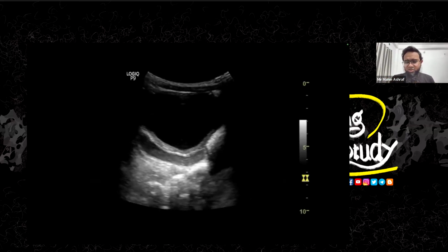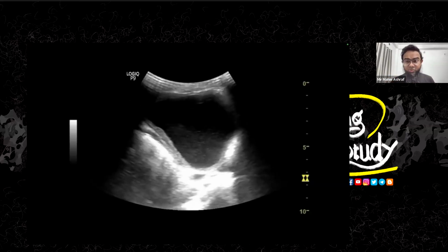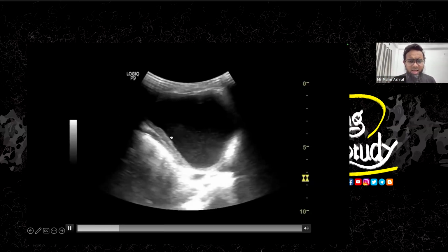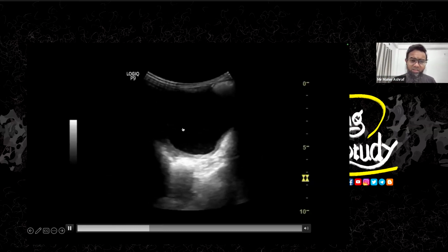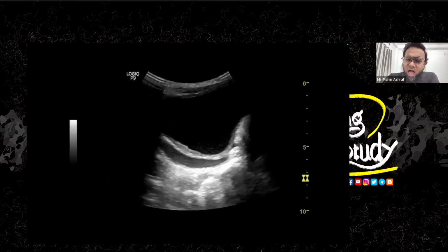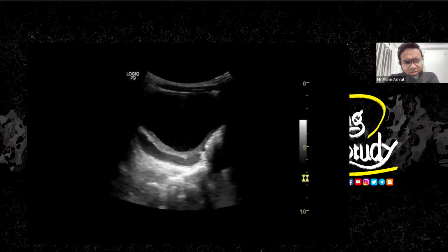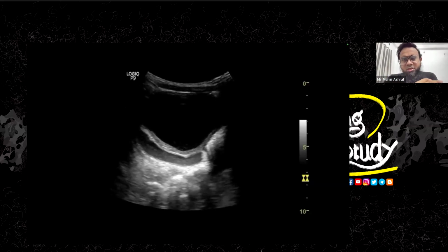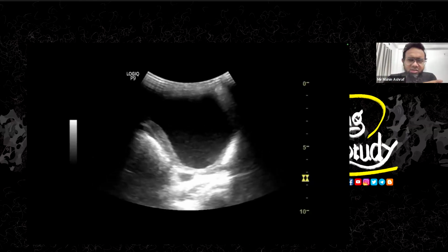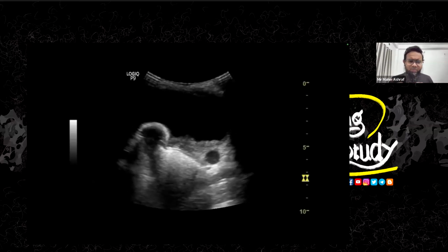I don't have any picture of the kidneys, but the patient obviously had bilateral hydronephrosis. You can see the wall thickening here, and there is a big calculus within this urinary bladder. The patient was around 8 years old, so I was a little bit confused how this bladder can have this type of situation. It's very unusual. The patient gave me the history that there was some surgery at an early age, but the patient's father couldn't show me any paper, so I was a little bit confused.